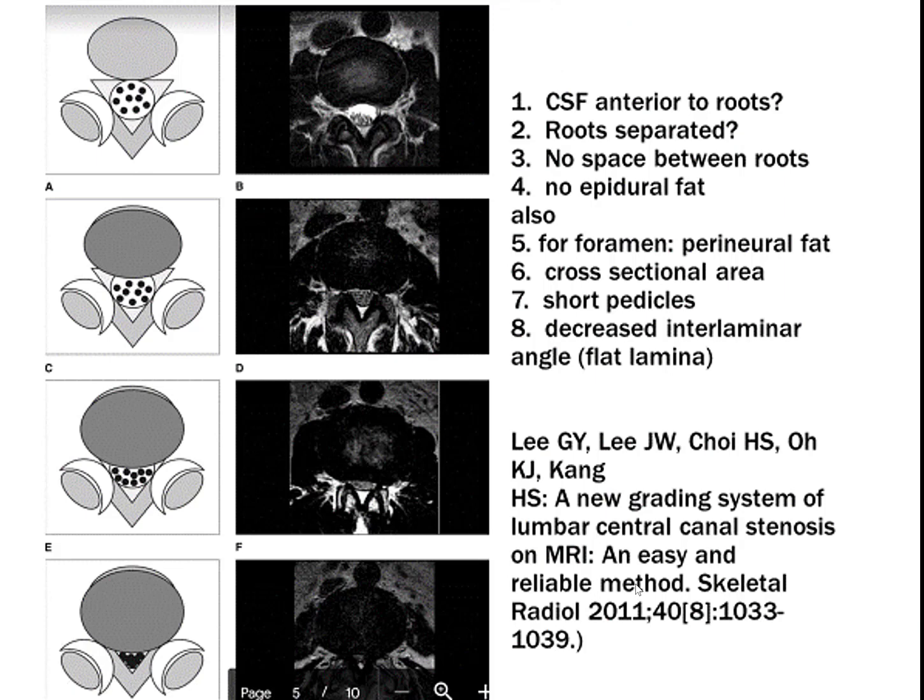And this is a very nice article that I want to share with you that I read from Skeletal Radiology, 2011. The typical description for spinal stenosis is you just look at the spinal canal and measure it. In the old school ways, some radiologists just say severe or mild or moderate, and other times you say, oh, it's 5 by 5 millimeters or 10 by 10 millimeters.